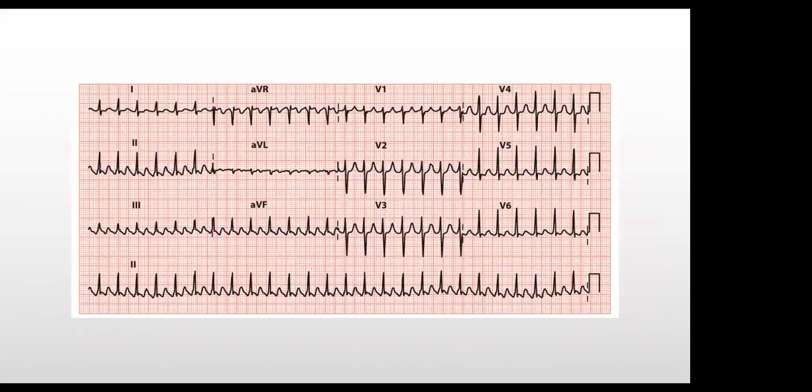So I'm sure we know this. Spot diagnosis: fast, regular, looks like flutter waves, right? Yes, sir, they are flutter waves. Sometimes you can't differentiate, but it looks like 2-to-1 atrial flutter because of these flutter waves. If it is regular, the differentials are atrial flutter, SVT, that's AVNRT, or sinus tachycardia.